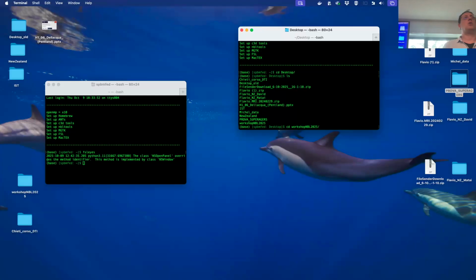Now, if you look at preterm or neonatal babies, it is a challenging data set because there is a lot of movement. You probably need to fine tune. If the data is really corrupt or has a lot of motion, you might want to manually remove the worst ones because you're not going to recover them anyway. Then the data set is more manageable, because if it's a mess, the preprocessing is not doing miracles. It just gets confused and gives errors.